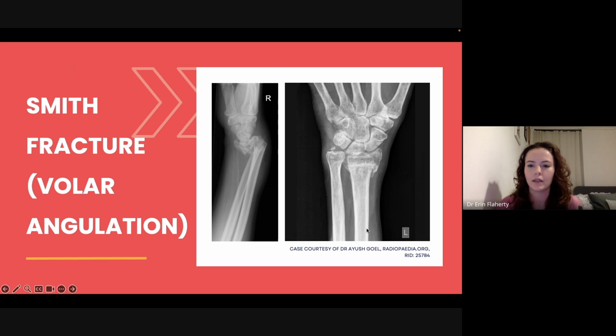So having a look at these x-rays here, do an ABCDE approach. If we go straight to B, we can see that there's a fracture here. We can't really see if it's displaced. It looks a little bit shortened. You can see that the radius has dropped compared to the ulna, but we don't know from this view alone how displaced it is. That's why it's really important to get a lateral as well, and we can see here, ooh, really displaced.